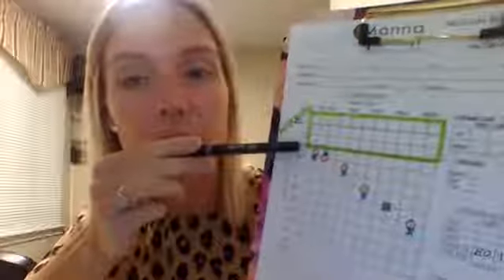So this is just a generic example. So again, the red is the right ear, blue is the left ear. You can see that normal box at the top. And you can see how the hearing, none of those marks are within that green box. So none of those marks are in the normal range. So this person has a hearing loss all the way across the board.